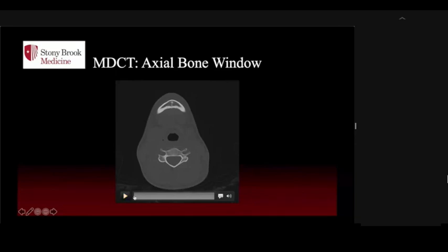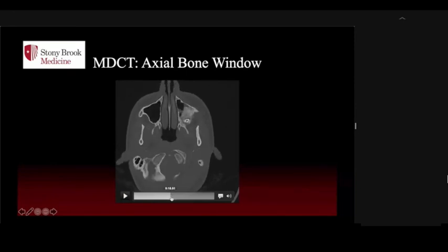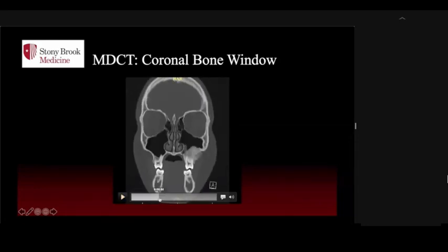On our axial bone window CT, we can appreciate this mixed attenuation entity, which seems to be displacing the walls of the sinus medially, anteriorly, and superiorly, and it's also causing some erosion of the buccal plate. As you can see here, our lesion seems to be growing and expanding into the adjacent soft tissue. We can also appreciate on the coronal cross sections that the sinus floor is elevated. However, it's maintained, but our lesion is growing and extending beyond the buccal cortical plate.